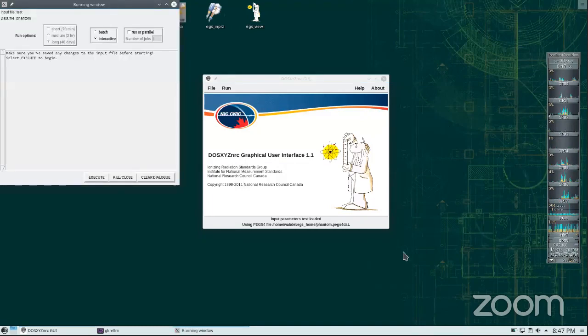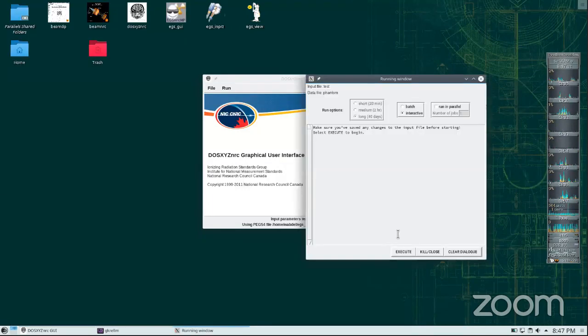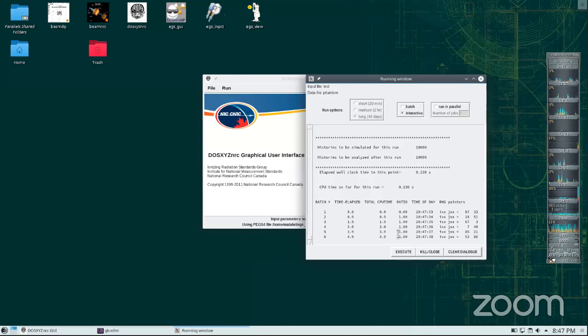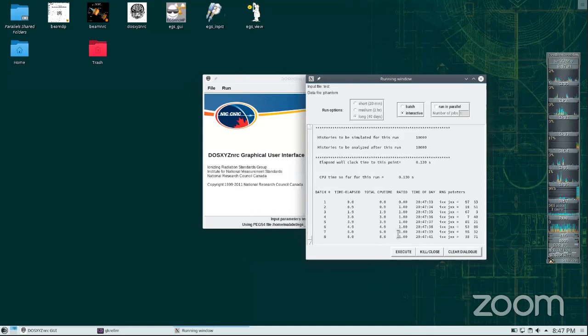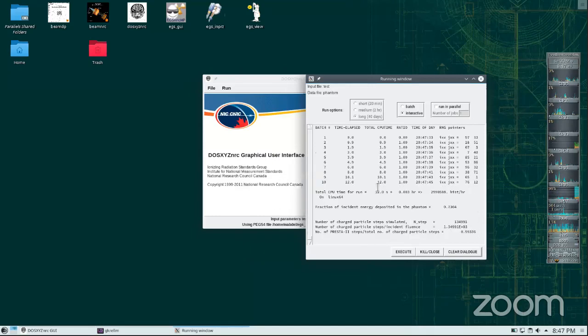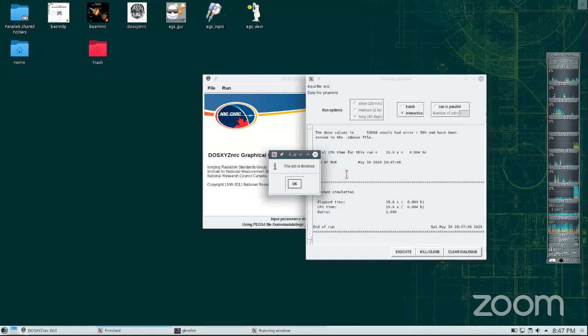You see, I'm getting 1, 2, 3, 4, 5, 6. That is fine. That means I have no problem in the output. Maybe the output is completely wrong, like the regions are wrong and the medium are wrong, but at least I did not miss any, or the field size is wrong. Could be.